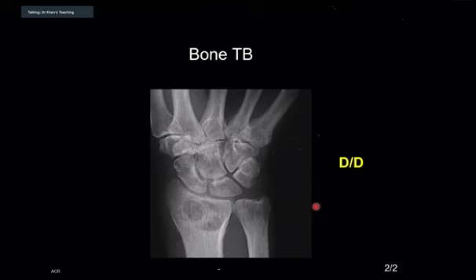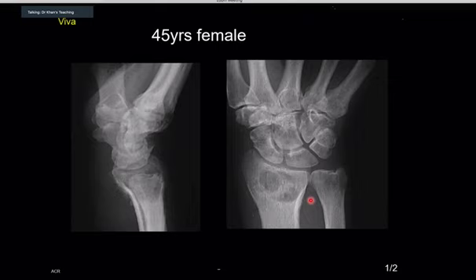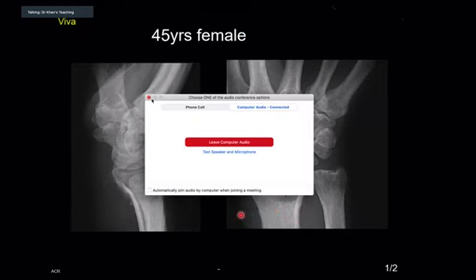In a child, chondroblastoma. In an adult, giant cell tumor. So giant cell tumor is classical. This is a classical location of a giant cell tumor. Giant cell tumor is slightly eccentric. It has no marginal sclerosis. Of course, usually it doesn't have a periosteal reaction, but for me, giant cell tumor will be the primary differential in this case, other than infection.